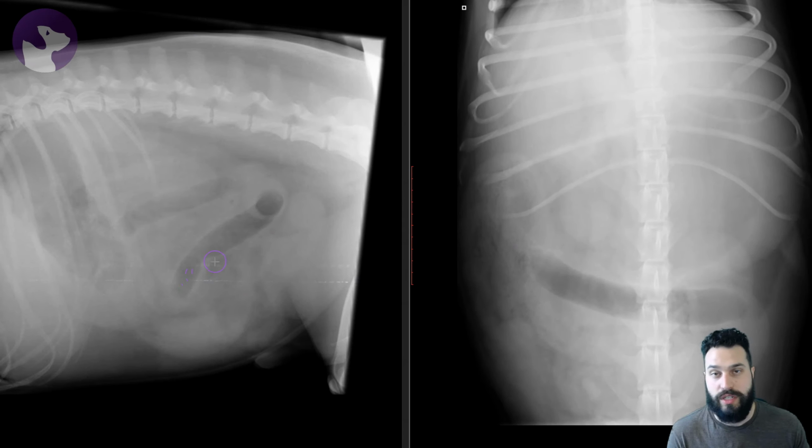When we think about judging small intestinal obstruction, we think about taking the largest loop of small intestine, looking at the diameter, and then comparing it to the smallest segment. In those instances, if the largest segment is twice the size of the smallest segment, then it's probably obstructed, or at least twice the size. So that's one thing to look at. That's two populations of small intestine, or a differential bowel population. The other thing to look at is the character of the material in the intestinal segments and where they're located.